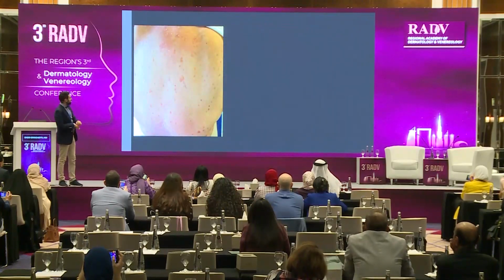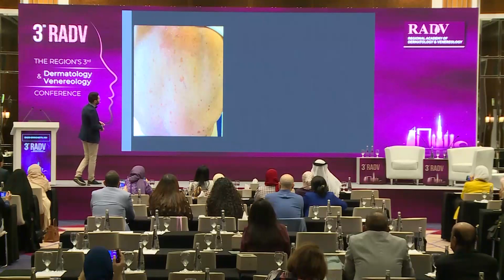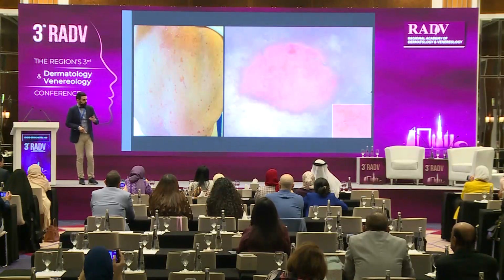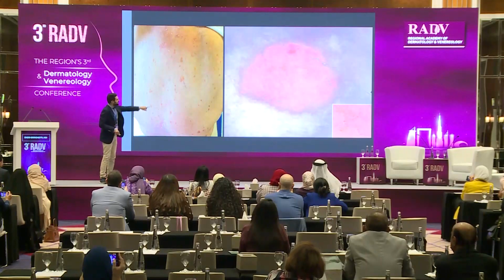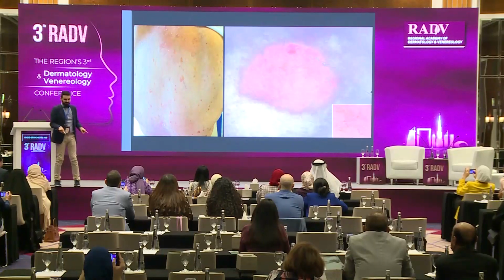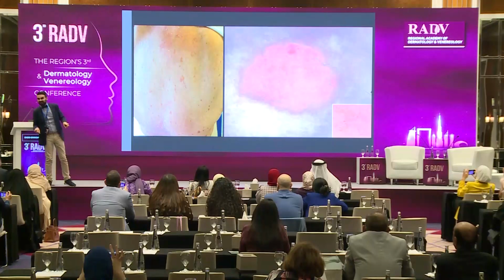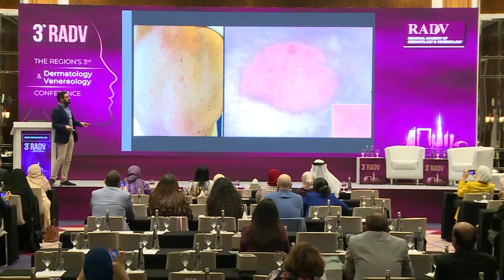And then this. This was a nice case. This man came for this eruption, no symptoms. Orange. The lesions were all the same, monomorphic. Do you have any idea? No, it's orange.